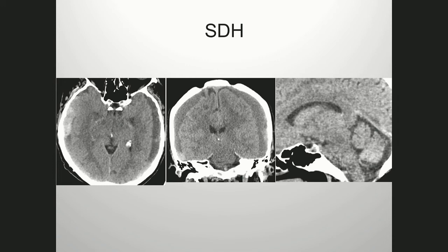But occasionally we're able to catch this in advance and see that, well, maybe this patient has subdural hematomas related to CSF leak. So one of the clues is, although it's not as elegant as MRI, we do have sagittal reformations on all of the CTs that we do. And you can see there that there is some problem here in the brainstem, and the optic chiasm is kind of flat, not quite right.